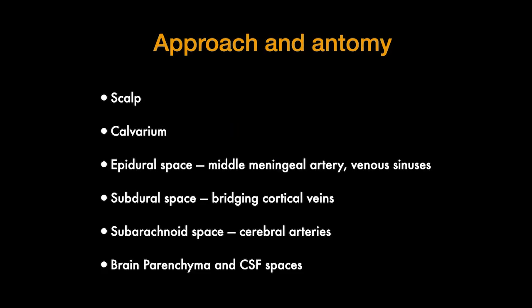Okay, so the approach to looking at a head CT and evaluating it is, in my opinion, probably best done from the outside in. So I start with the scalp, the calvarium, the epidural spaces, the subdural spaces, the subarachnoid space, and then finally the brain parenchyma and the ventricles and cisterns.